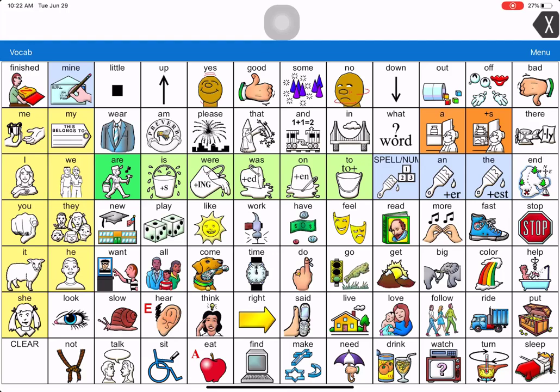All right, when you're using LAMP Words for Life, sometimes when you're following an individual's lead, you want to use a tool called Vocabulary Builder. Vocabulary Builder is a great tool. It allows you to follow the individual's desire to say something, and when you see they want to say something, you can give them that word where it's more isolated and easier to see.